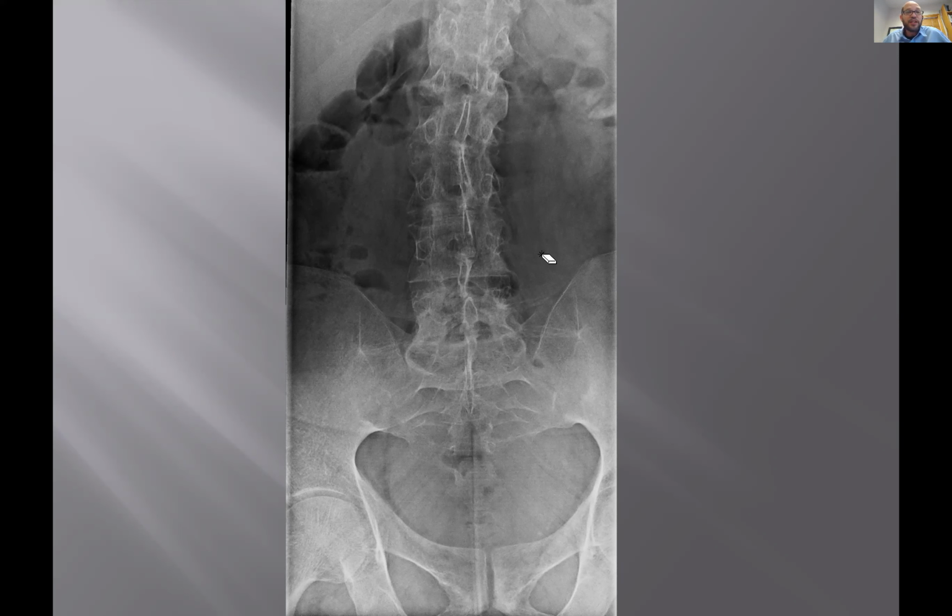Systemic lupus can cause subluxation that is reducible. Yes, it can. A transitional lumbosacral segment with a unilateral accessory articulation affects the biomechanics in a big way of the SI joint. And speaking of SI joints, AS fuses the SI joints. Am I being nice or what? That's an easy quiz.